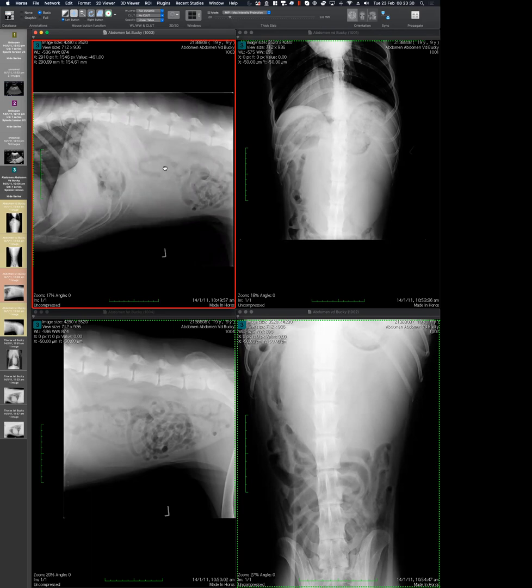I guess you're looking at splenic torsion or a large splenic mass. Because of the possibility of a torsion, it would be ideal to have a look with the ultrasound first to see if there's blood flow. Very good, very good. I agree with those comments. And I also agree with the consideration.